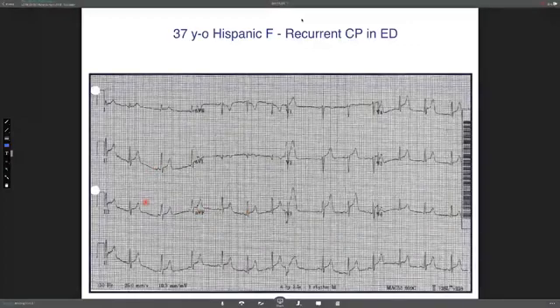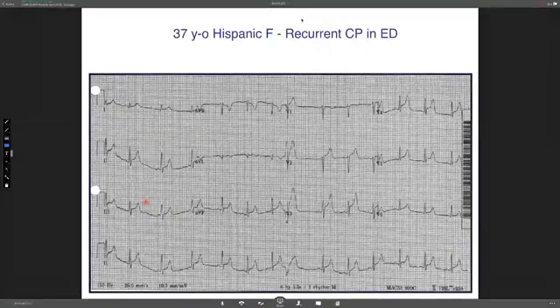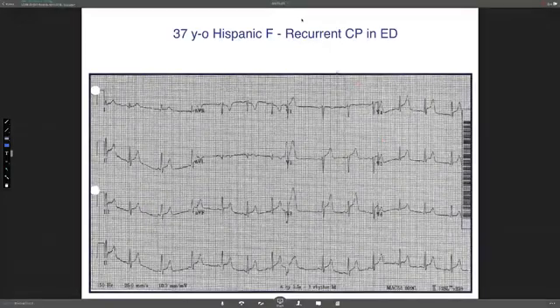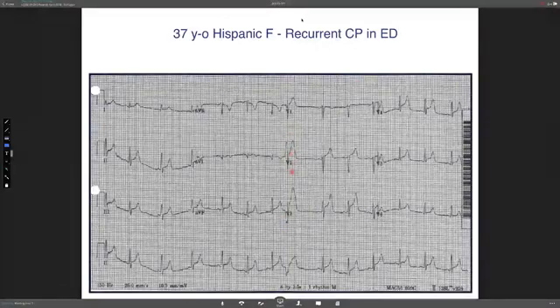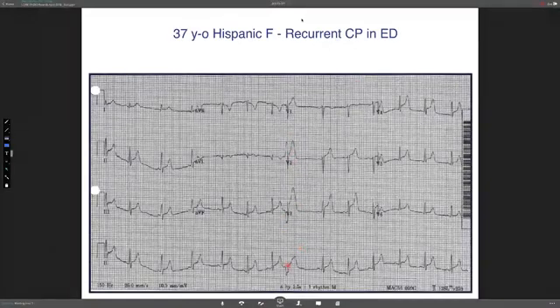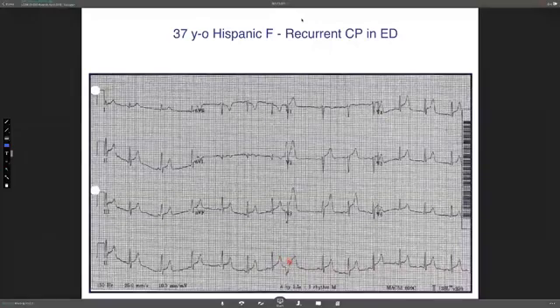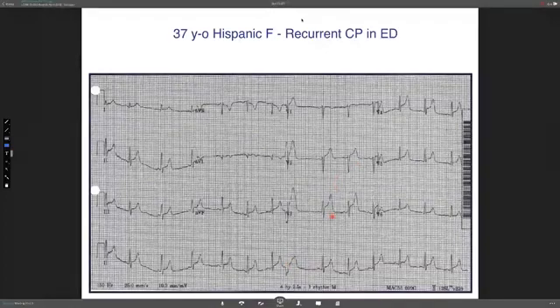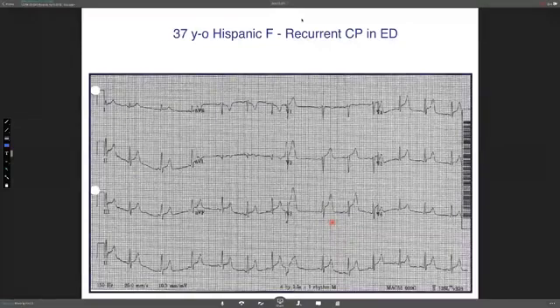So this would be an abnormal EKG, I assume. There is a PVC there. I think everybody cannot miss that. There is a PVC here, which happens after the termination of the T wave, but clearly there's ST segment elevation. So I think everybody should have seen this by now.